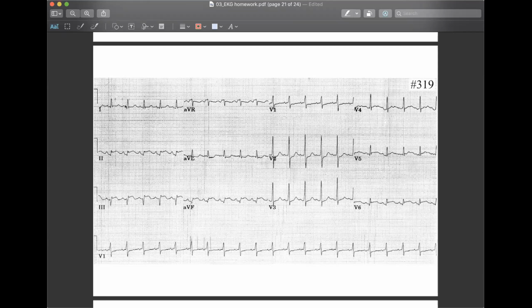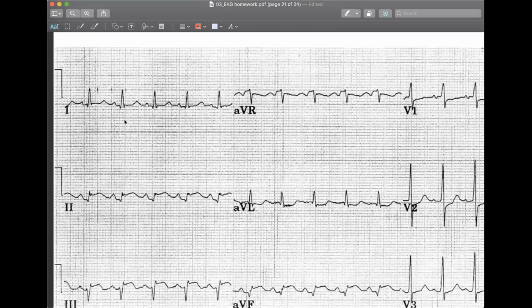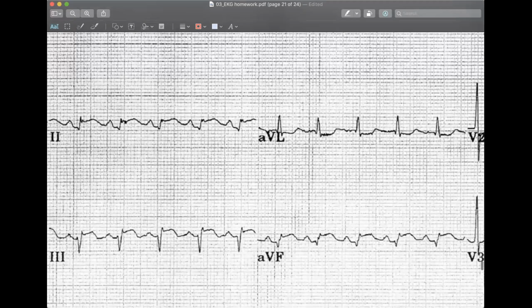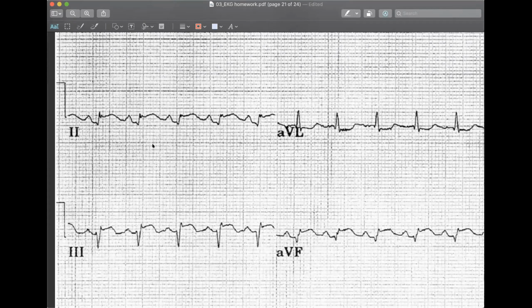I won't say it. Okay. You can enlarge it. Let's enlarge a little bit to AVF. Let's compare. Can you share? Let's see your cursor. I don't know how to make it. Okay, go all the way up, and you can see the control panel. If you punch it, the control panel falls down, and you can see a mouse over there. Remote control. Yes, remote control, and assign it to me. Okay. I think yes, thank you very much.